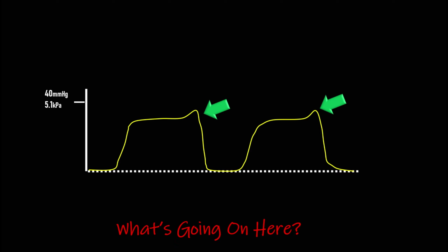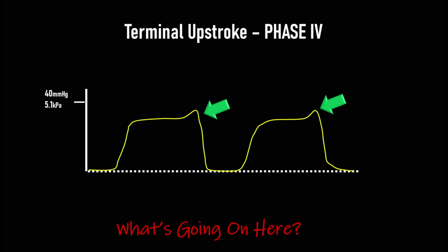The sudden peak of pre-inspiratory expired CO2 is caused by abrupt airway closure. That last bit of gas is cut off. Sometimes this is called a phase 4 wave, and it is seen in patients who are morbidly obese or pregnant, and it's due to increased intra-abdominal pressure.